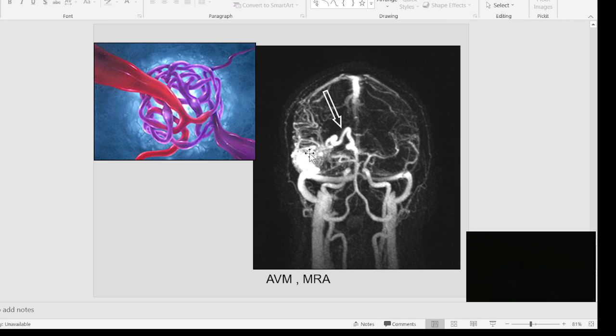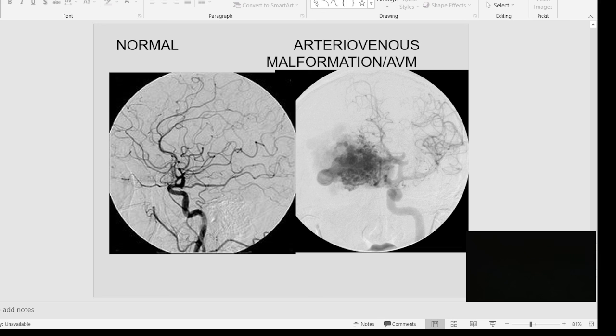Now, sa surface naman na siya. Just imong subarachnoid. Pero kay tungod dako siya nga network sa blood vessel man makakompress sa brain. Kinahanglan na siya i-clamp. Kana mo ni appearance sa AV malformations.